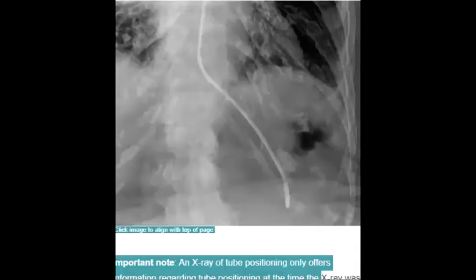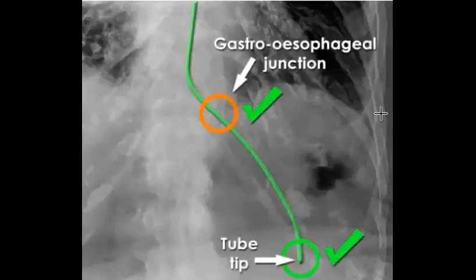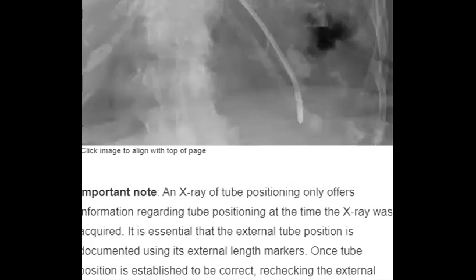For example, this patient, when he shows you the rest of the image, it is going well on the left side of the abdomen. So it is going well. Okay? Yes.